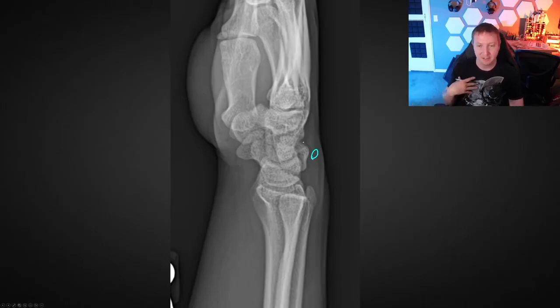I'd like to claim credit for making that up. I was the first one to ever put it on the internet. So many people say that I made it up. I wish I could have been smart enough to make that up, but I didn't make it up. But I usually get credit for it. So if you want to blame it on me, then that's fine. Pooping duck sign of triquetral fracture.